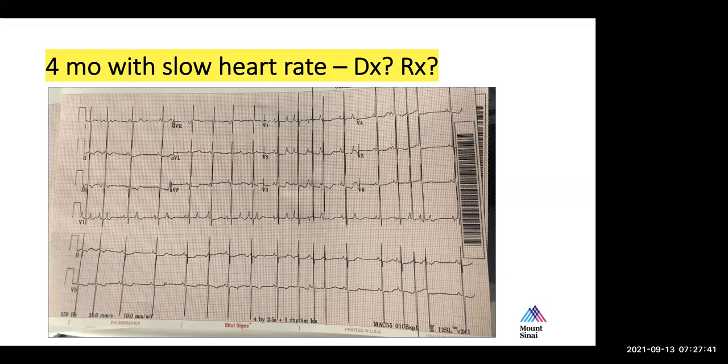So the lead that caught my eye is V1. I think you can see the atrial tracing the best, and it does look like we have 2 different P-wave morphologies. The one that's not as tall, I think, is the sinus, because it does seem to conduct to a QRS and it doesn't seem to be as erratic. And the one that's much taller looks like an EAT that's not being conducted one-to-one, especially in the very beginning. So I think it's intermittent EAT and PACs with EAT that's not being conducted one-to-one.